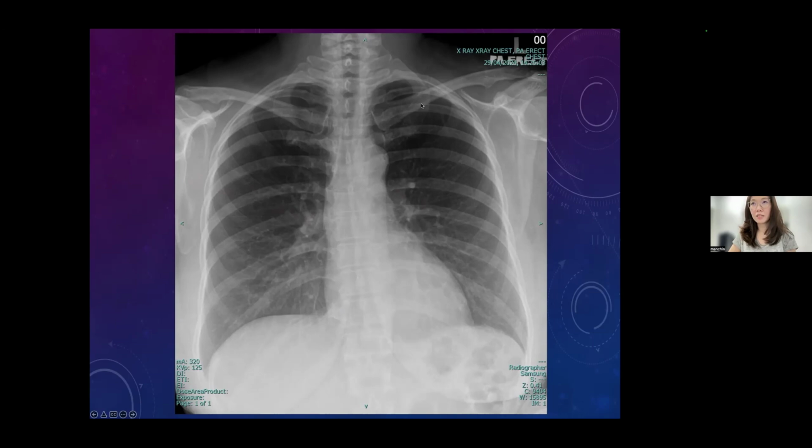Okay, see, when you review the area again, the apex, then you will look at this pleural line here. I see. So there's a very minimal right apical pneumothorax. The patient is going for an operation that is not related to this. Not related at all, just an incidental finding. So this patient has had pneumothorax for some time now. It's minimal and recurring a few times. Done CT also, there's a pneumothorax.